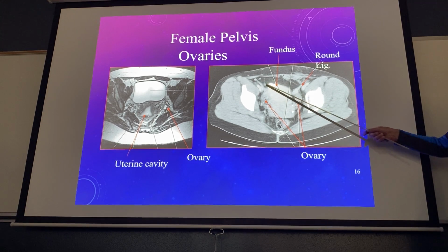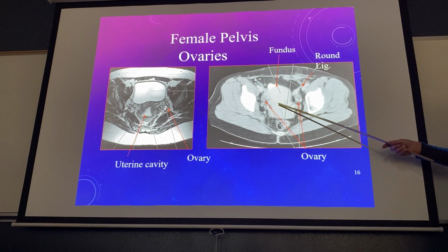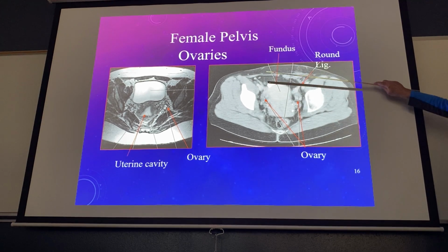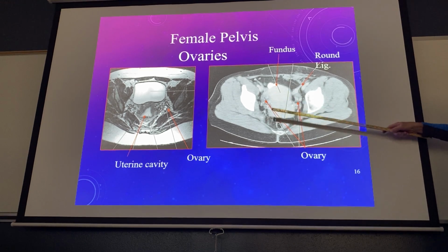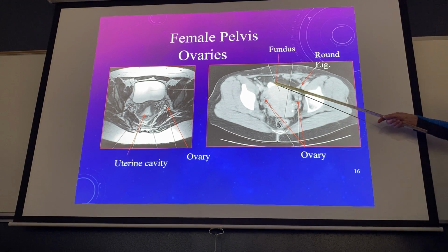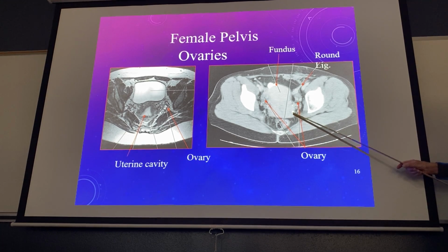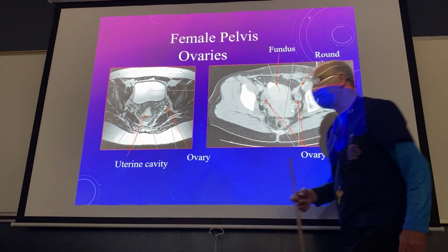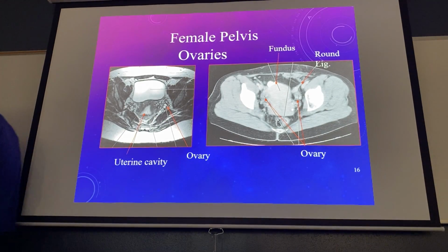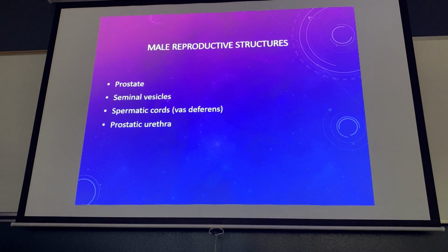Again, this will help you better distinguish fundus from body once we see the bladder, because the upper portion would be the fundus as we cut our way down, superior from inferior, and you'll see that transition of the fundus moving into body and cervix. Probably a little ureter right over here. We'll look at that better along with the round ligament. So we'll take you through these systematically, certainly on Thursday. It's kind of just an overview at that standpoint.